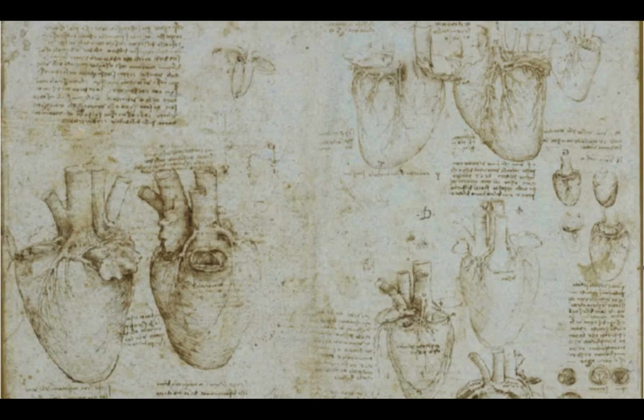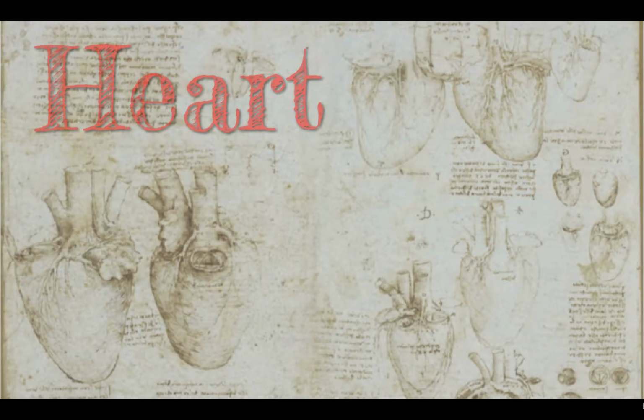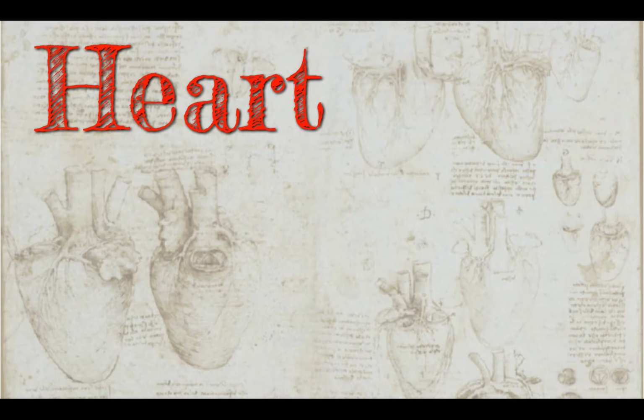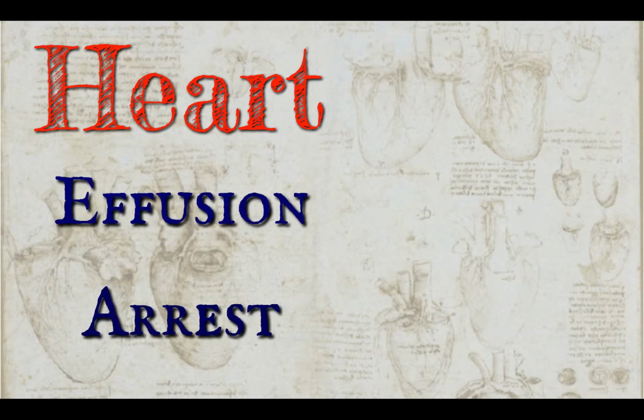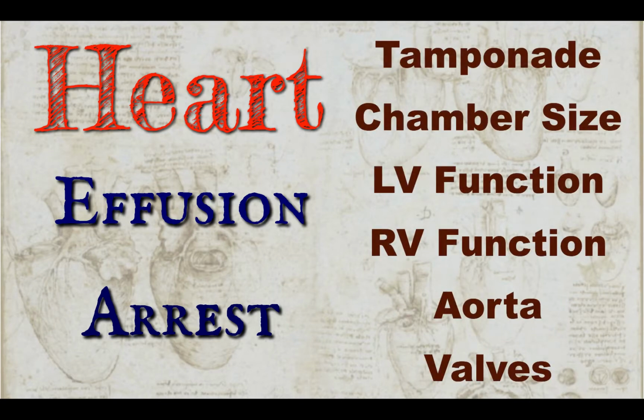Alright, let's get to the fun part. The last piece of this talk is about looking at the heart. Obviously, echocardiography is a complex field, but today we will talk about 2 key pieces of the emergency echo, identifying and interpreting pericardial fluid, and knowing what to do with those cardiac views during cardiac arrest, which, as you will see, actually applies to any peri-arrest sick patient as well. There are a lot of other components of the critical care echo which we'll only briefly touch on today, but we'll plan on exploring in more depth once everyone is on board with the basics.